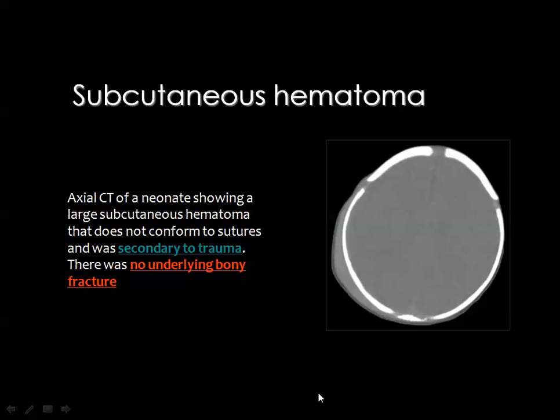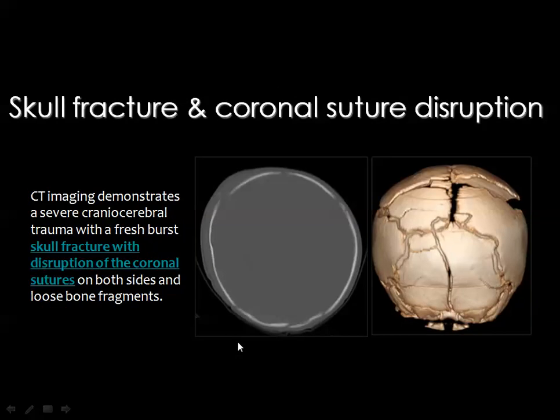And the subcutaneous hematoma or the subgaleal hematoma may be associated, as I have said, with fractures or may not, and it may be associated also with intracranial complications and may not. And it is better to discriminate between sutures, which are usually bilateral and symmetric, from the fractures to have the 2D or the 3D reformatted images.